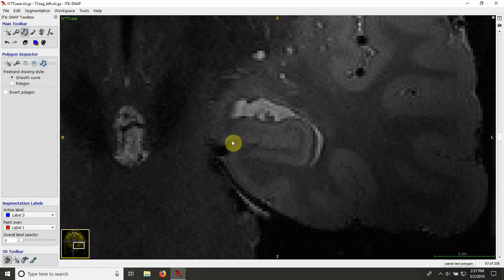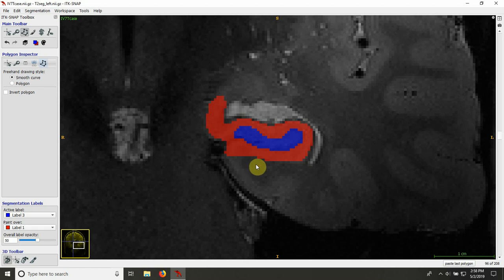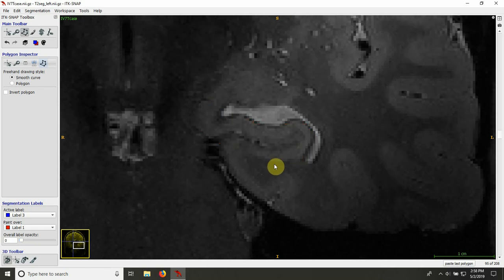And so I kind of split the dark band between the dentate gyrus label and the label of the surrounding regions. But there are actually quite a large number of differences or different approaches between segmentation protocols. Some include it in the dentate gyrus label, some in the label of the surrounding regions, and some actually give it a separate label. So I just want to point that out.